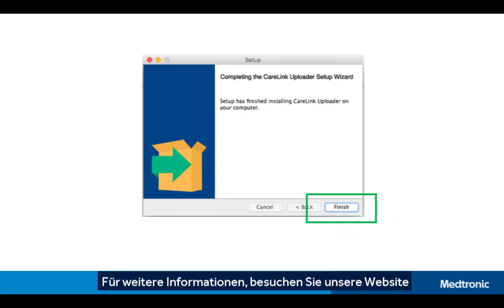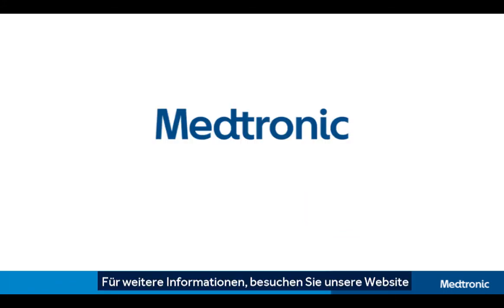For more information on viewing your CareLink reports and uploading your device, please visit our website.